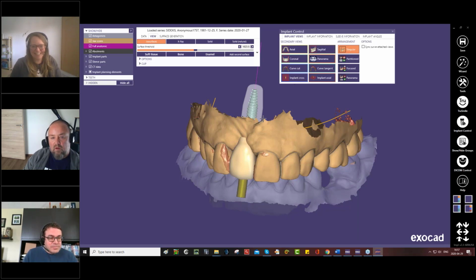There's now one question about the design of the implant restoration. Wouldn't it be easier to first make the final restoration and then draw the emergence profile? In theory, you don't have to define any emergence profile. You can just skip the step when defining the emergence profile border, and you just define the entire restoration, if it's a screw retained crown or whatever, and then later on you can define the emergence profile border.